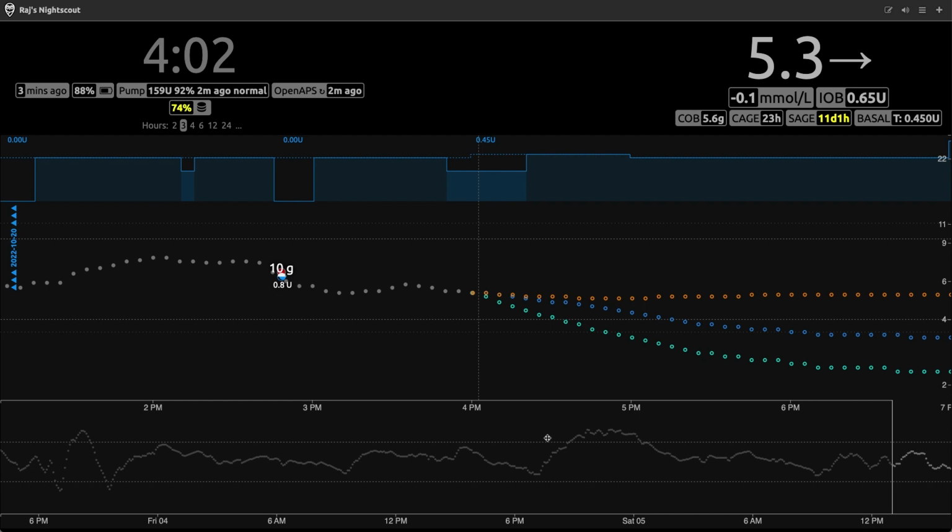running on AWS's free tier, connecting to MongoDB Atlas on its free tier, and doing everything that I need it to do, at least for the next 12 months, without any cost.